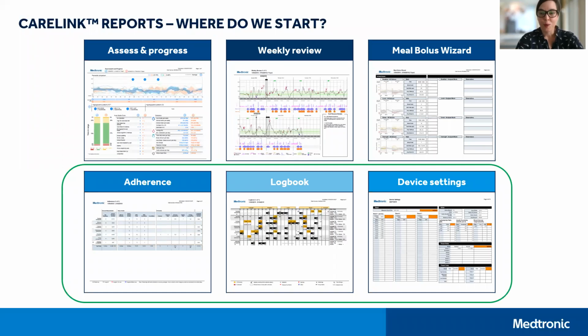The three reports we're going to look at today are the Adherence report, the Logbook report, and I just want to remind you about your device settings report, which is there and present and updated each time you upload your pump. So you'll always have the most current settings if you are uploading at home routinely.